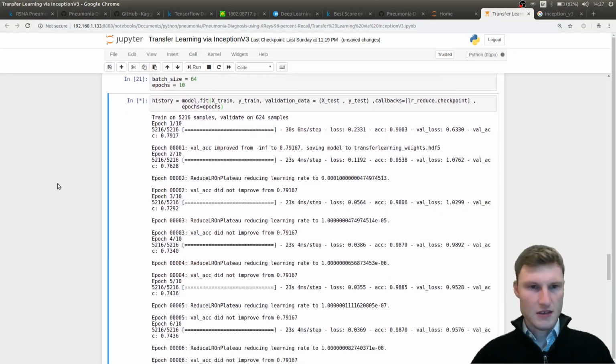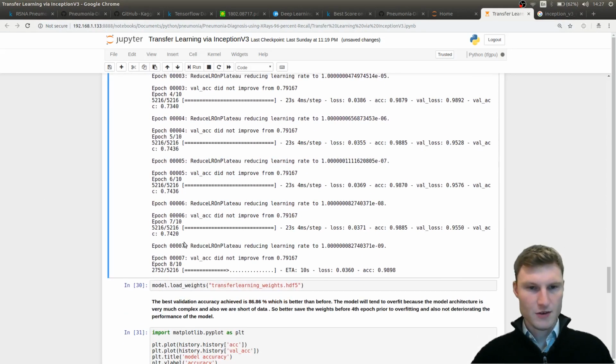Let's quickly see, it's training successfully. Yes, we're already in epoch 7. No need to pause here.